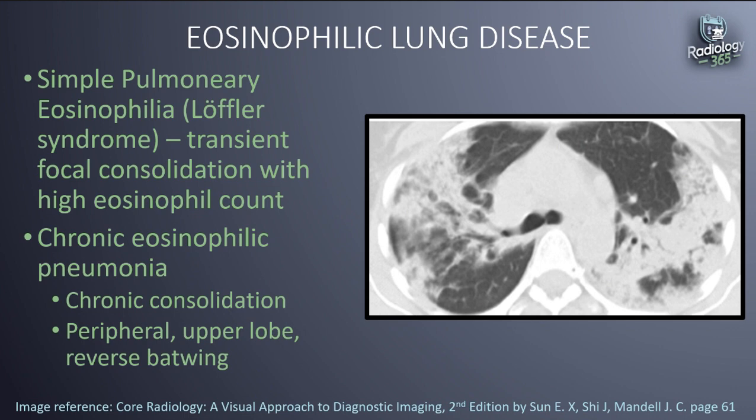So this image is an axial CT, and it shows bilateral patchy peripheral consolidative opacities. Of course, a peripheral smear would be needed to finally clinch the diagnosis of chronic eosinophilic pneumonia. And again, this should have been present for more than 6 months to indicate its chronicity.